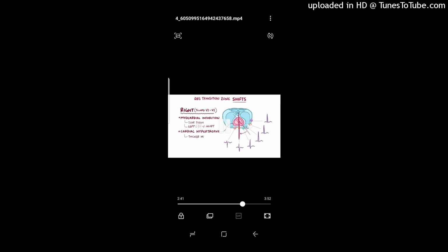In left atrial enlargement, the left atrium has extra muscle tissue, and that results in a P wave with 2 peaks in lead 2, with the entire thing stretching out over 110 milliseconds, with a gap of over 40 milliseconds separating the 2 peaks. In lead V1, the P wave is biphasic, meaning that it looks like a hill with a valley alongside it. The negative portion is usually 1 millimeter deep and lasts for more than 40 milliseconds.